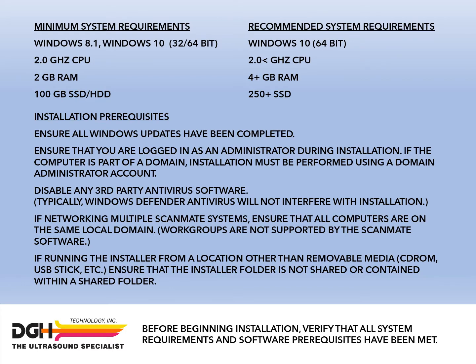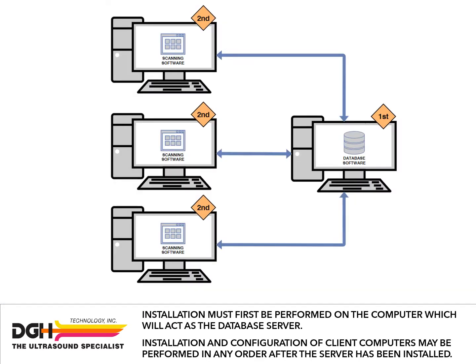Before beginning installation, verify that all system requirements and software prerequisites have been met. Installation must first be performed on the computer which will act as the database server. Installation and configuration of client computers may be performed in any order after the server has been installed.